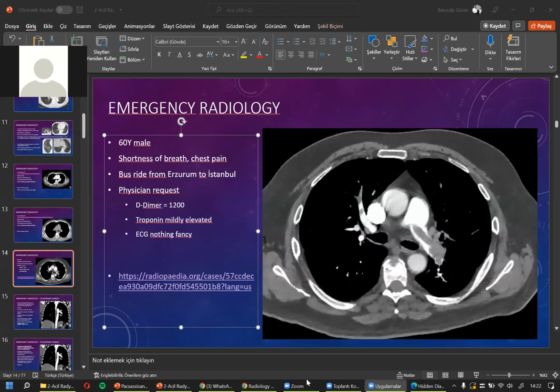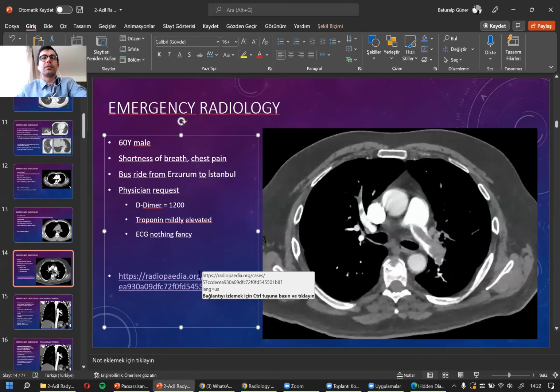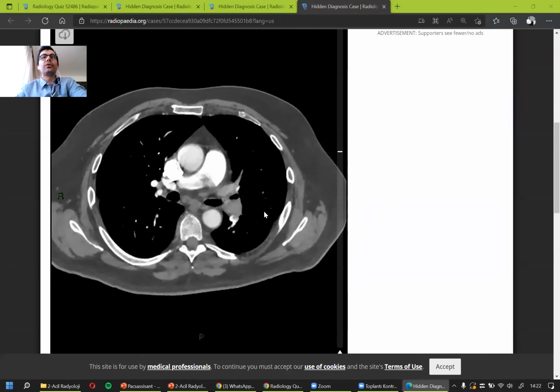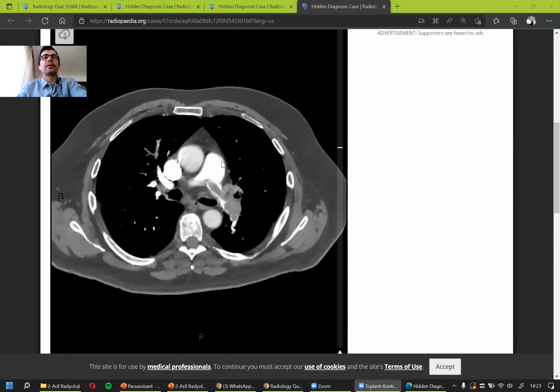Thank you, doctor. So it's not this one, sorry. Okay, I need to find the big pulmonary artery and the right and left ones, right? As we have, so the reverse Y or the X, right? That's what we need. So I'm starting with the main pulmonary trunks.